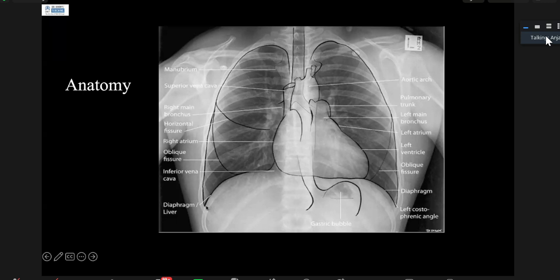That's why we are seeing the upper surface of the diaphragm clearly, but we are not seeing the undersurface of the diaphragm on an X-ray, because there is no air under the diaphragm. And that is exactly the reason why you are seeing borders of the mediastinum and heart, because there is air on either side of the mediastinum. So understand this concept that structures get a border or outline because there is air in the lung next to it, because this forms the basis of an important concept in the identification and localization of certain pathologies on X-ray, which we will discuss in later sessions.